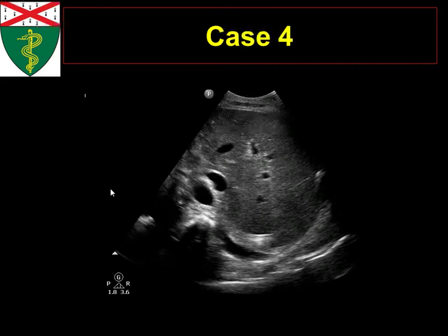All right. What's going on here, guys? What do you guys see? Transplanted liver. They're all transplanted livers, I promise you. All right. You see this and you see this. What do you think's going on here? Technologist shows you this. It's a post-op liver. Seeing a little collection over here. Do you believe them? Gao doesn't believe them. He's looking at it really suspiciously.